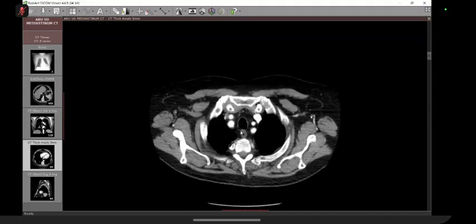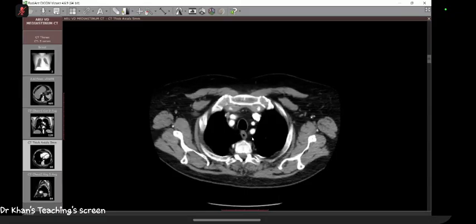You see this? Please remember that the esophagus is in the posterior mediastinum, right? So it is common sense. It is sitting anterior to the spine. And here you can see a bit of a lumen. This is the posterior wall of the trachea. Develop your eyes, because this wall is flat, right? But it is not hard. There is no cartilage there. So there can be a bit of indentation. On the other hand, if there is frank invasion by an esophageal carcinoma, then it will be a T4 tumor.